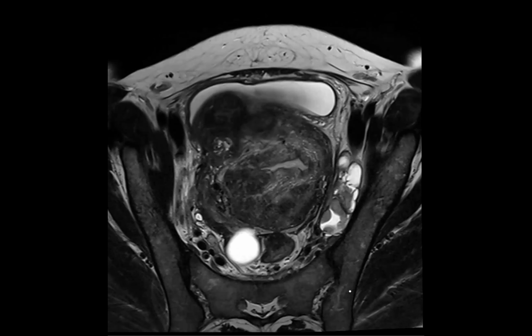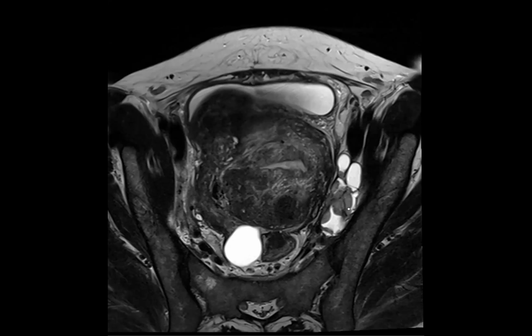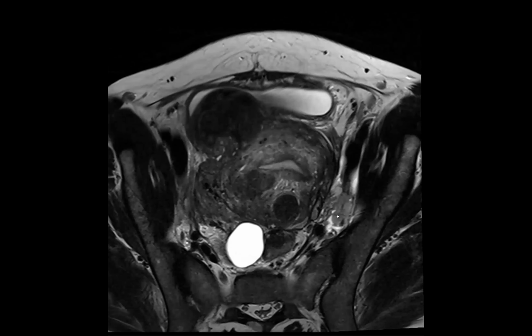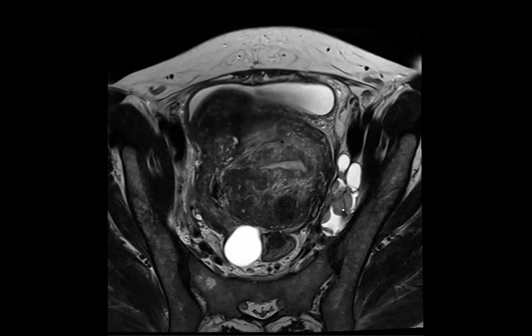So the teaching point here is that you can have these enhancing things. This is part of the history: the patient had a ruptured endometrioma before, and this is all part of that process. And you can have these enhancing things that restrict. I still think you have to bring up that it could be malignant. I have one that looks just like this that was malignancy. So they can be benign, but you have to bring up malignancy. You know what I mean?